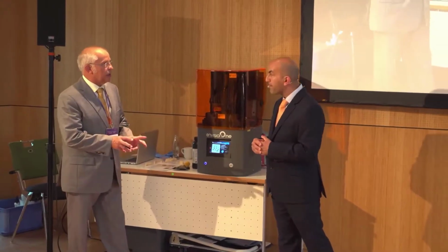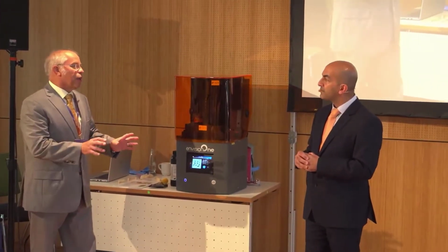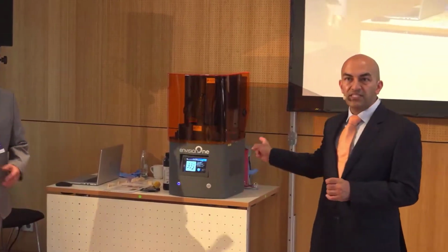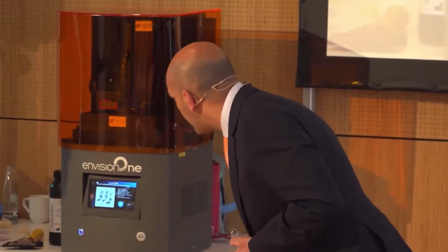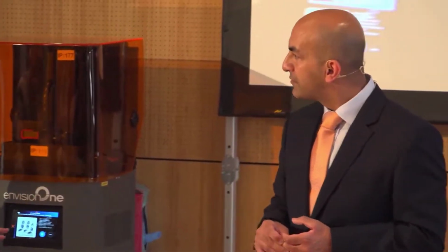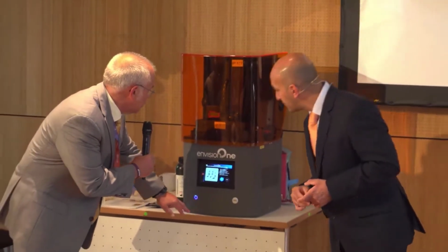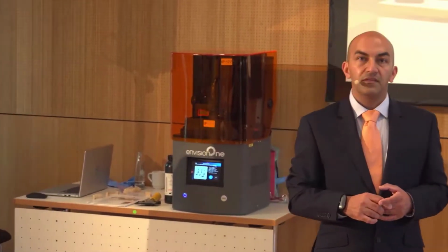Okay. I calculated the cost. The material cost will be about 3.5–4 euros. So what Udo said there was he's actually put that guide in 3 times in there. So it's going to print the same guide 3 times, and it was a total of 20. Yeah, it's calculating now. It's at about 25–26 minutes to produce 3 guides.